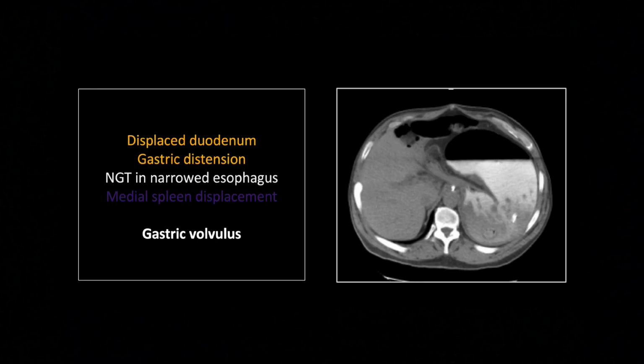Our next one is a gastric volvulus, and this is a mesenteroaxial gastric volvulus. And so the whole stomach is twisted on its mesenteric axis. And the thing to really point out here, the most helpful little tidbit I've ever read, is that in these cases, the pylorus and proximal duodenum will be above, superior to the gastroesophageal junction.